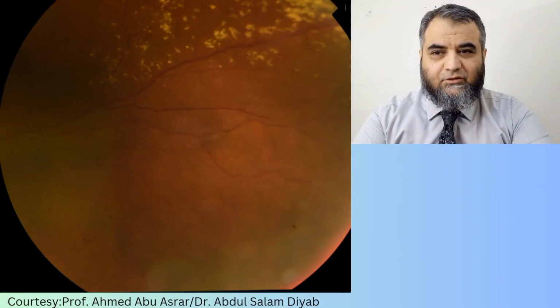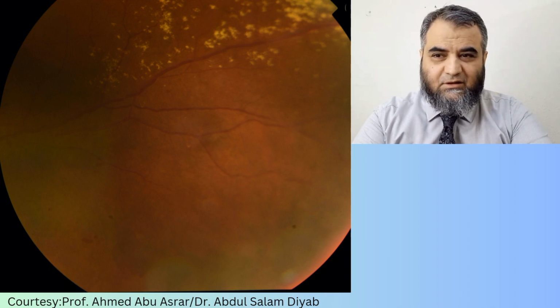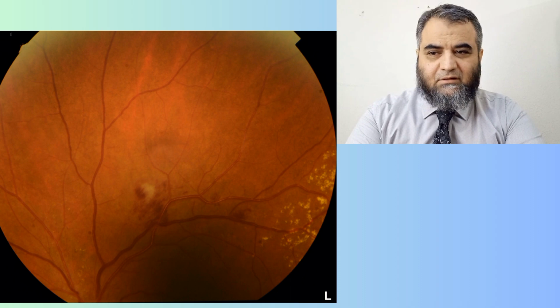This is another slide. Here you can again see the peripheral hard exudates, like miliary. Miliary is basically a word meaning seed-like, small seed-like hard exudates which are dispersed over there. So it is typically that appearance which is shown, with some scattered hemorrhages, and vessel tortuosity at some locations can also be seen. Another slide showing hemorrhages, a macroaneurysm, and hard exudates.